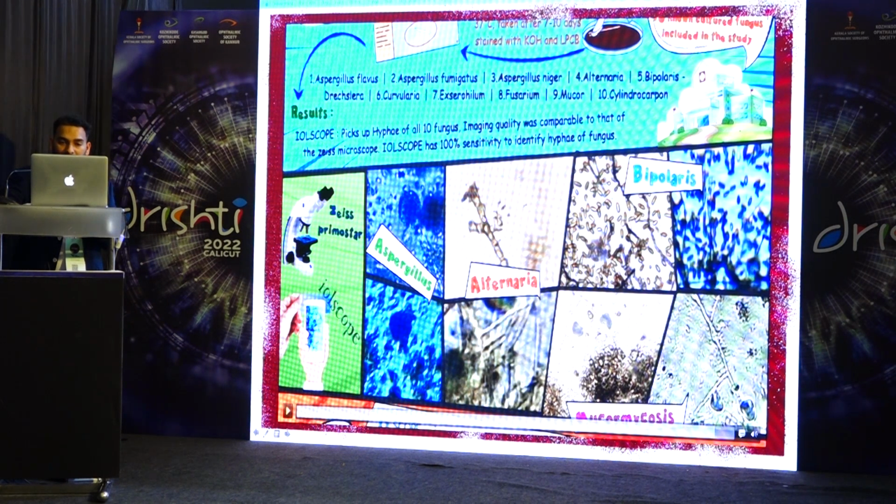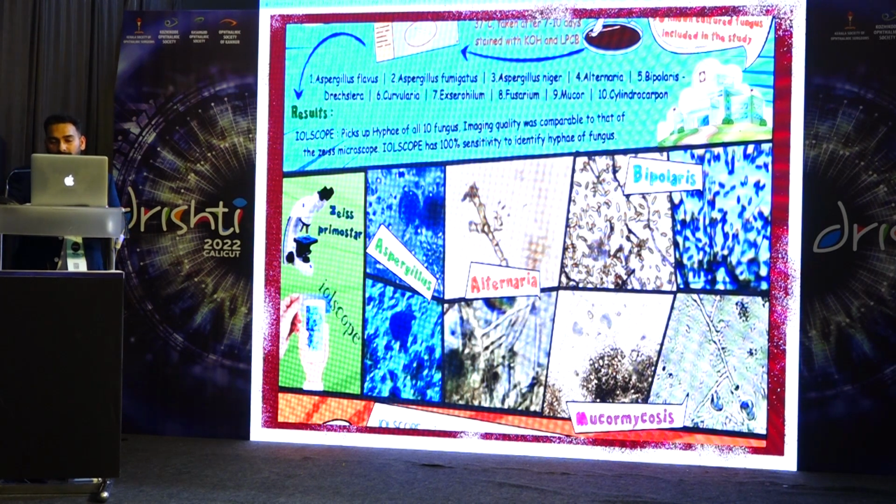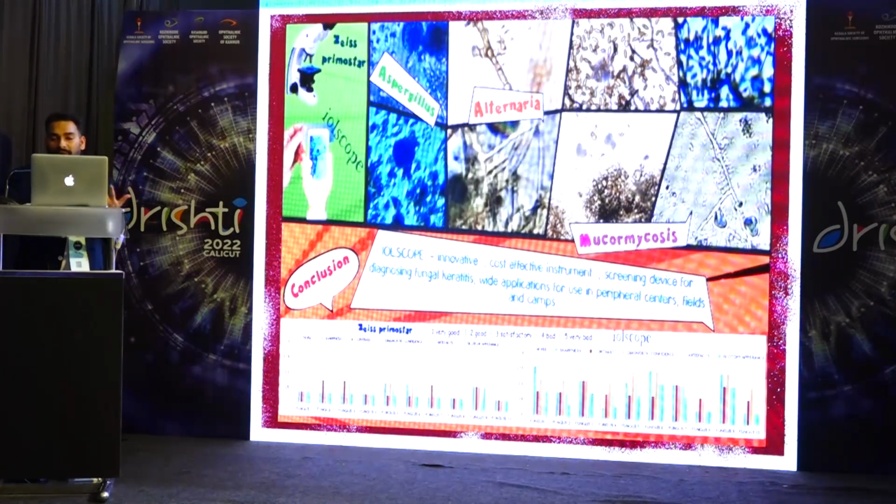This is Alternaria in the microscope, and this is from the IOLSCOPE. Bipolaris in microscope and IOLSCOPE. And here mucormycosis. We compared the quality of images and found that the quality was good enough to understand if there is a hyphae or not.